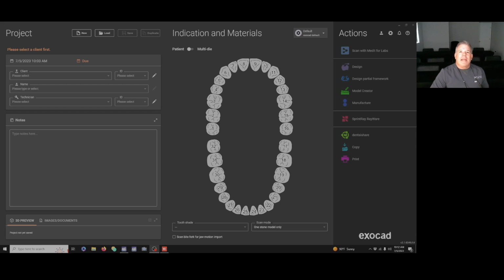In session 1, I gave an introduction to the Dental DB, the database, and went over some basic features and indications of that software. And we showed how to create a new job, including how to change material and parameter settings. We then introduced the Dental CAD software. It's the second part of exocad, where I demonstrated some basic and advanced features of the user interface to include hotkeys. And we'll continue to go over that and drive those things home as we go through the different sessions. We went over using the wizard versus expert mode, and we'll certainly go over that more as time goes on.